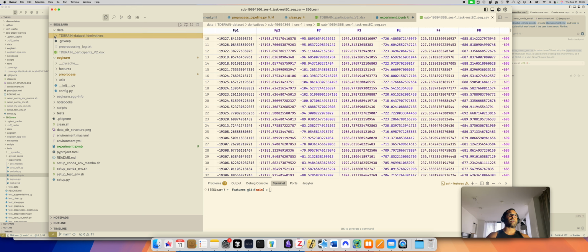But if you make it 0, it'll clean every single file that's inside this TDBrain dataset. Okay, so all the parameters you want to adjust can be adjusted here. For example, the length of the epoch you want, and if you don't want epochs, you can just take this epoch length parameter out entirely, and the default is to not do any epoching. So it should be fine.